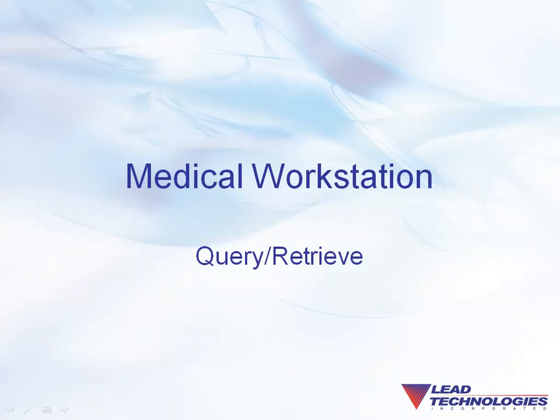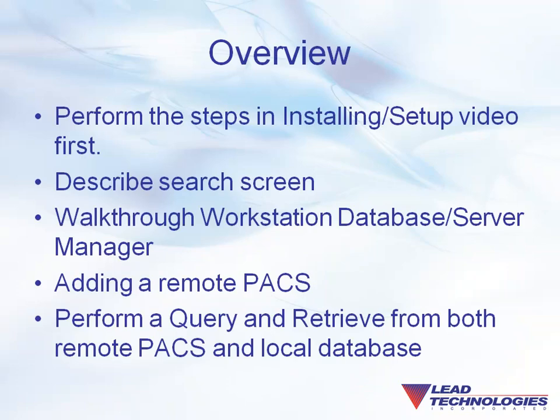This video will show you how to use our Medical Workstation Viewer to perform a query and retrieve operation from a remote PACS server and from the workstation's local database. If you have not already performed the steps detailed in the Medical Workstation video, installing setup, you must do so prior to performing the steps outlined here.